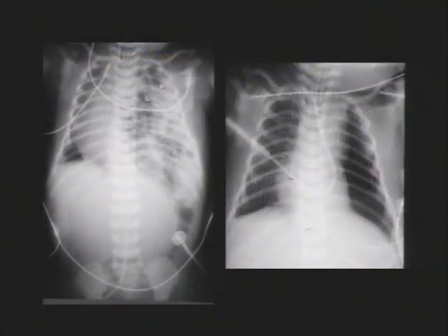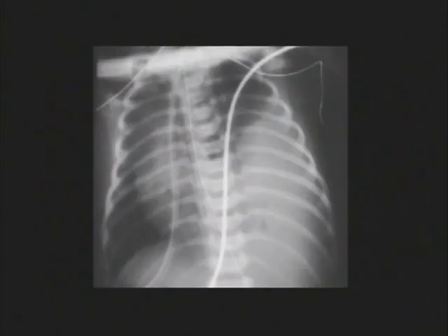Here is a patient that had a diaphragmatic hernia, and you can see the marked shift of the right lung. Now, when they go in and repair these, they do it from the abdomen, and right after, you'll see that they have a very small left lung and an air-filled left hemithorax. This is not a pneumothorax that you need to call them all into a panic about. They know it is going to be that way because there's no lung to fill up that space, because that lung didn't have a chance to grow.